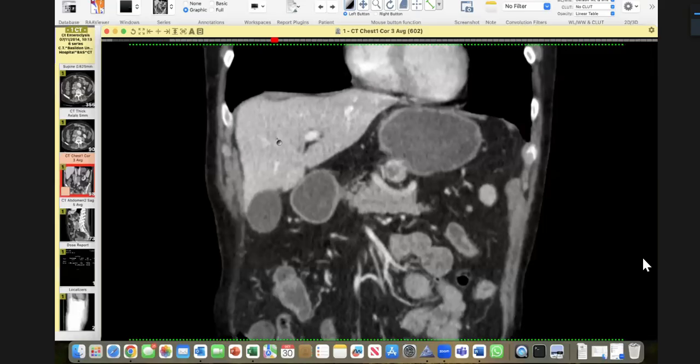Classify for me pancreatic neuroendocrine tumors. So it can be insulinoma, gastrinoma, VIPoma. Depending upon the symptoms, gastrinoma would of course give multiple... I asked you to classify. I am just interested in you naming names. So insulinoma, gastrinoma, and... So what do you think this is?